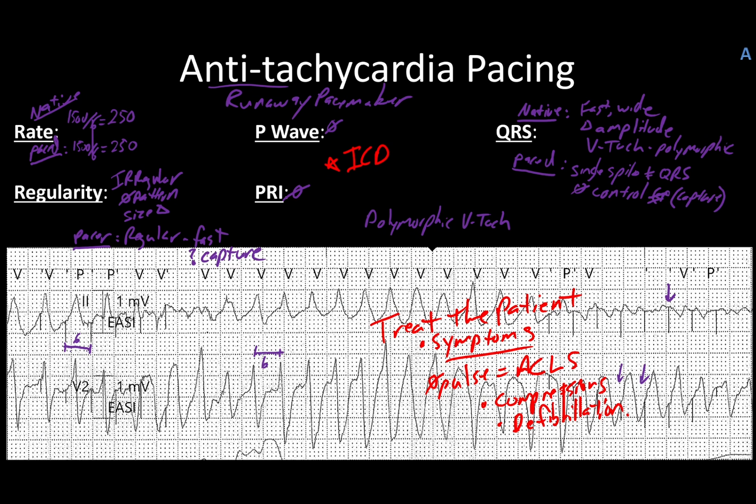Last little thing I'll make mention, I've made mention in the past, but I'll just take the opportunity to give you the reminder. We know that it's VTAC, or the strong information that supports that idea is that if you look at your gauges here on the left, you can see that the amplitude of those waves far exceeds that gauge mark.